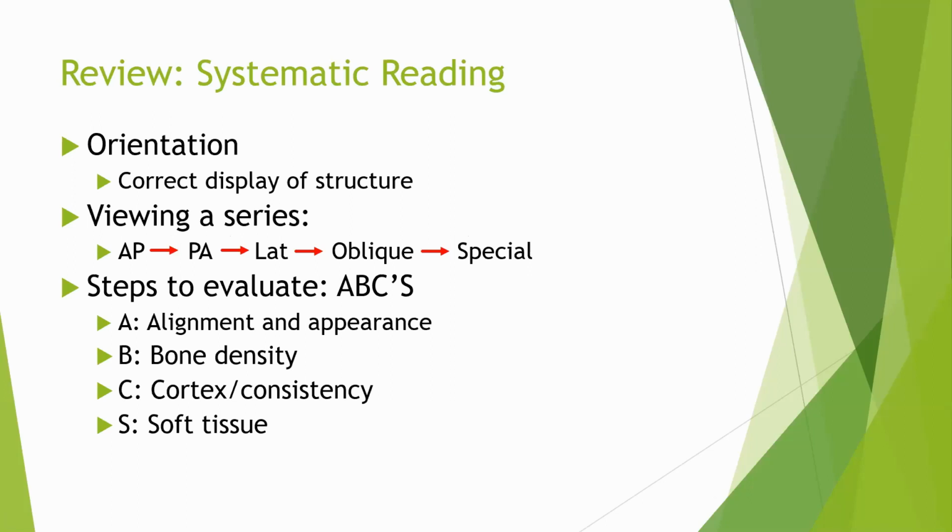for individuals. Let's say there is a hangman's fracture, where the odontoid process is basically broken down and impinging on the medulla oblongata or the spinal cord, the breathing center. For that, you have to make the patient keep the mouth open and do an X-ray. It's called the PEG X-ray, where you open the mouth and have a better view of C1, C2, and a little bit above and below to have a correct diagnosis.